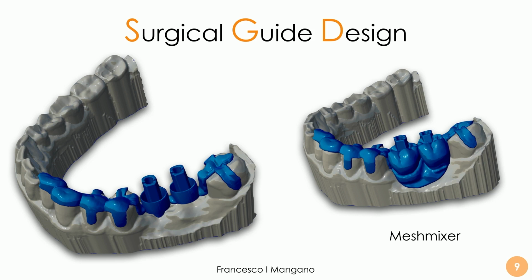and it is a guide that can be tooth supported, or in some cases tooth supported and bone supported as well, thanks to the application of artificial intelligence using software, for example, like Relu or DiaGnocat. Is it possible also to obtain a bone segmentation that is automatic and use this bone segmentation for making, in this case, through a Boolean operation, a surgical guide that is not only tooth supported but also bone supported.